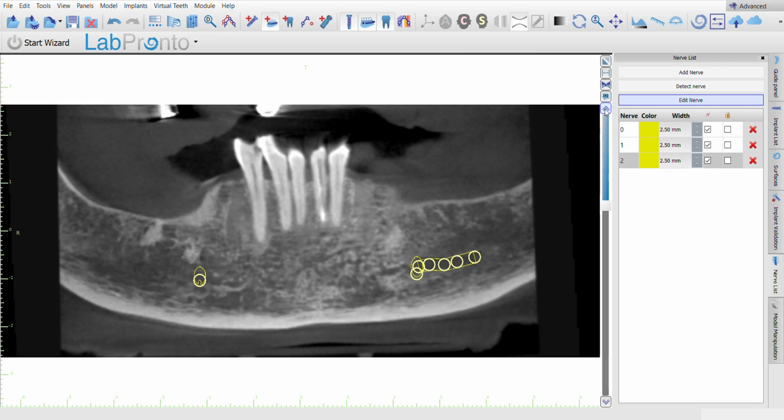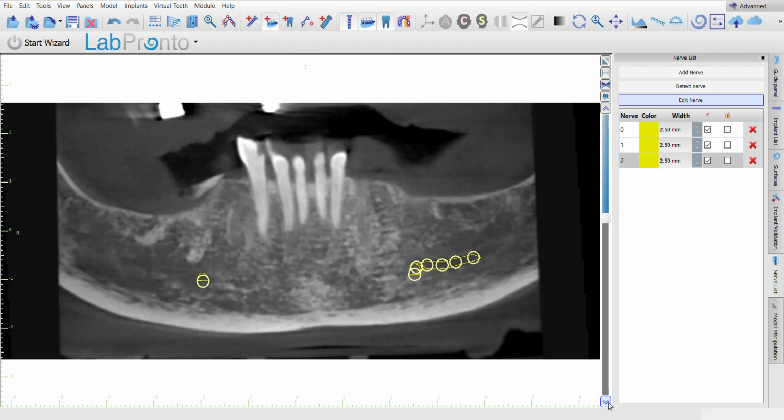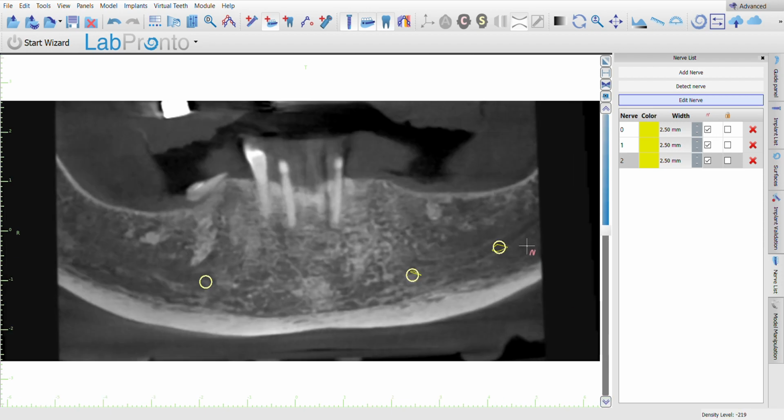So go back and now scroll again. You won't lose what you have done, and you won't ruin anything extra. Now you can see as I'm scrolling, now I can see the nerve. So I scroll back here, now I see a couple more, come back, one more click, again scroll. Oh, I see a little bit more. Okay, so this is good. Now I see edit.